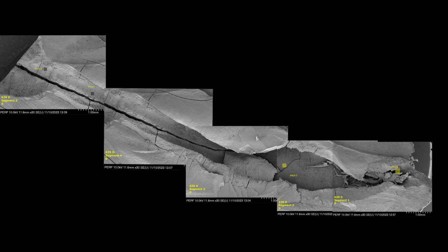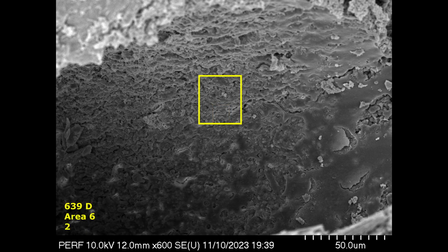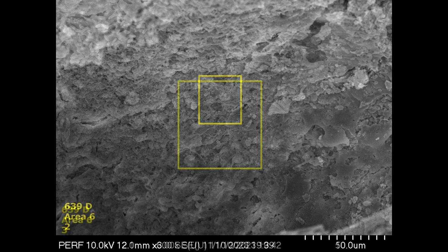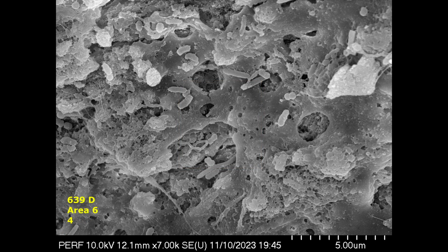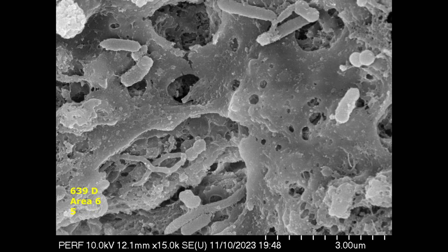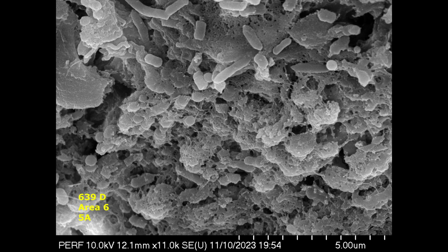And looking at various areas in the distal root, there were some areas where there was a massive biofilm evidence. For example, if you look at the side wall here, it's pretty much covered with a biofilm with EPS. And some demineralization of the predentin as well.